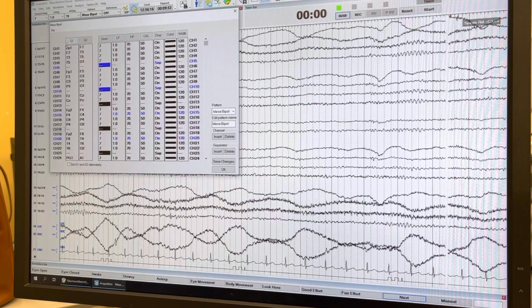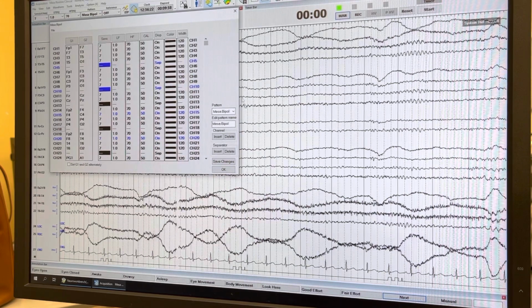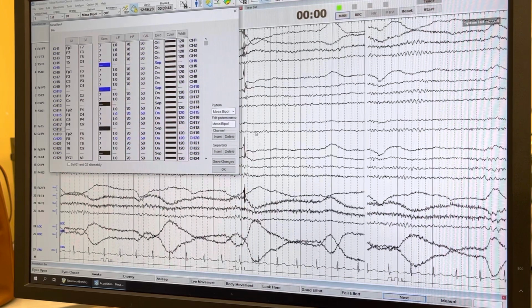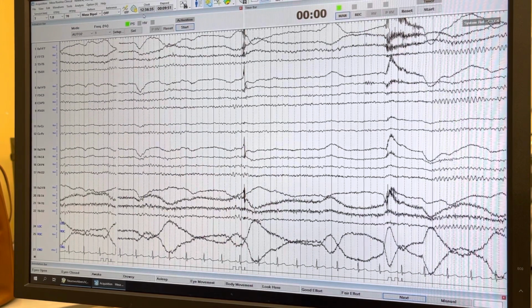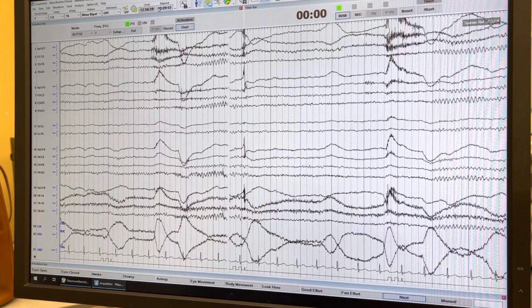But anyway, it shows you your montage and all your settings. We went over this a little bit. I just got trained on this yesterday, so I'm a little bit unsure yet here. So I'm going to shut that off. But anyway, that shows you your montage. Here's a clock right here, and here's the time elapsed, time recorded in the test.